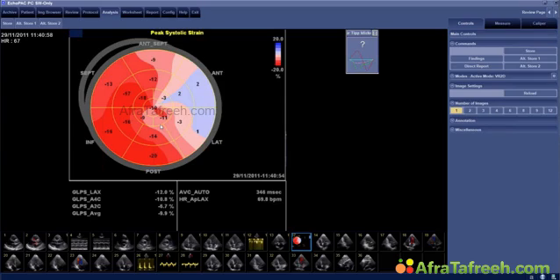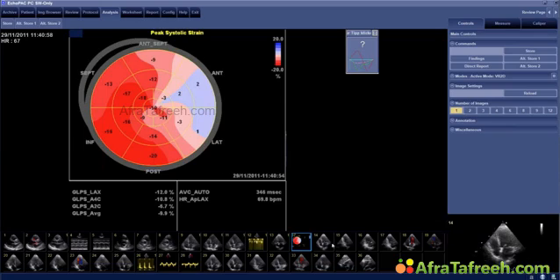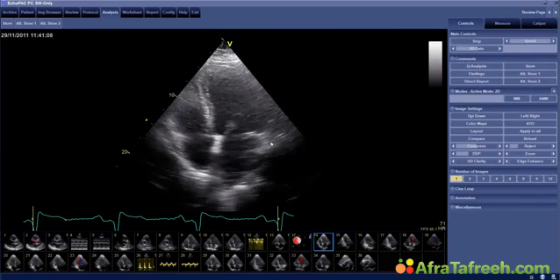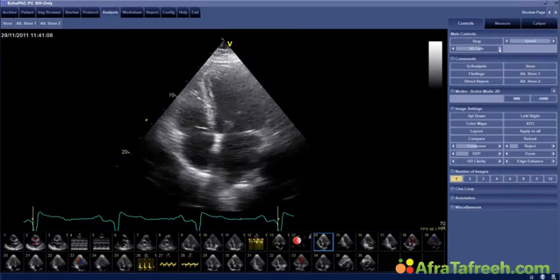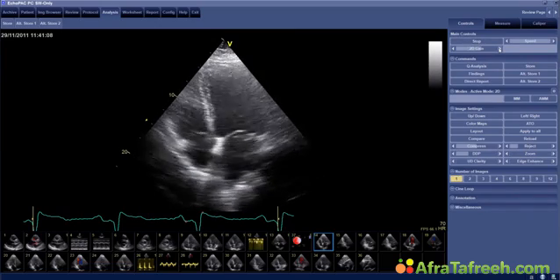So I personally only use it if I'm sure that the tracking algorithm was good and that I know that some wall is there that can be interpreted. So in this patient, I would say it's a bit of a borderline already, because the image quality, going back to this image here, is not so good. But nevertheless, it does work in this patient quite well, and in reality you can use it in many, many patients.